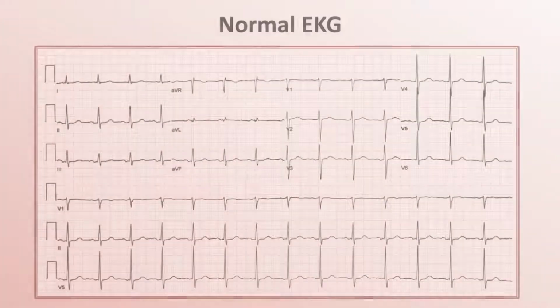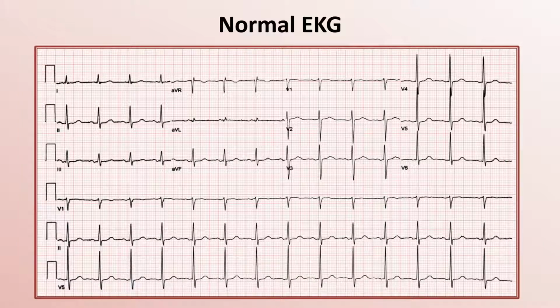Here's an example of a normal EKG. If you are an EKG reading novice, all of these lines and squiggles may be intimidating at first. We'll be learning about the different lines or leads in another lecture.